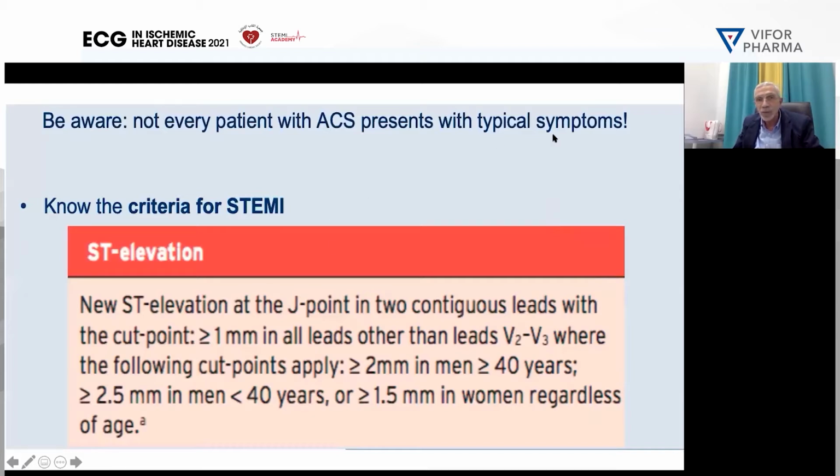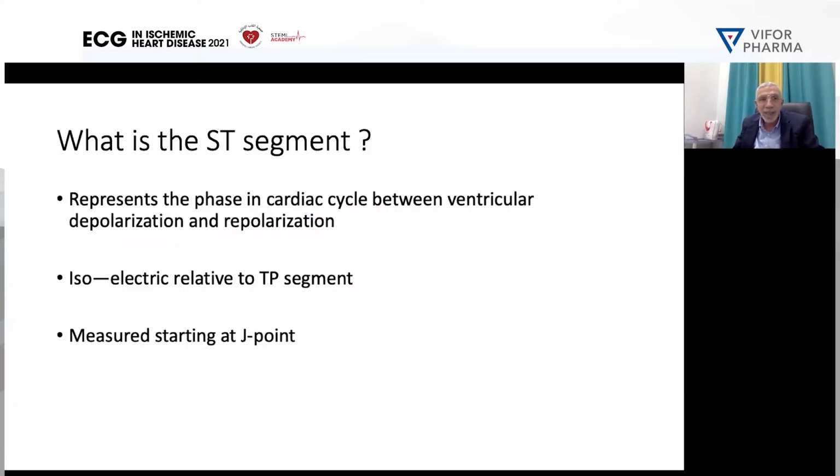This is very important, as Dr. Zubaidi said, that when you say ST elevation, there is some criteria. You have to look to the J point. Dr. Zubaidi will discuss it during the cases. But just to tell you how to look to the J point, I will not spend time because we already delayed a little bit. So you have to decide where is the J point, and based on that measure your ST segment.